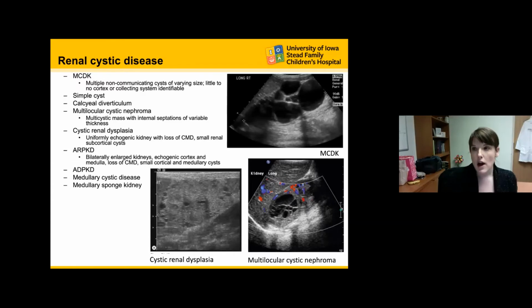Okay. The latter part of the lecture is going to focus on prenatally diagnosed hydronephrosis and classification for that. But before we get into those, I wanted to comment on some common renal ultrasonographic abnormalities that we see in infants that can be difficult to differentiate, and things that you can look for on renal ultrasound that help you to distinguish between them.